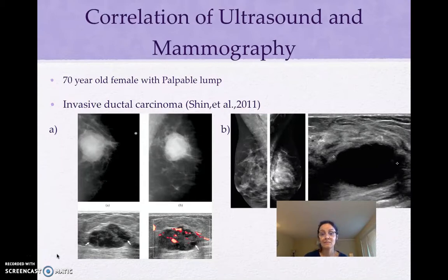And then the next image shows some lesion was found in the mammography, and then they sent the patient to the ultrasound, and it was totally cystic, and it's just benign, and they just send the patient for further follow-up a couple of months later, to make sure that it doesn't increase in size.